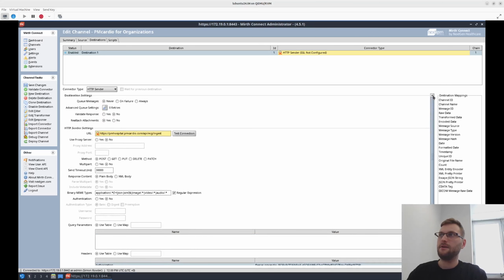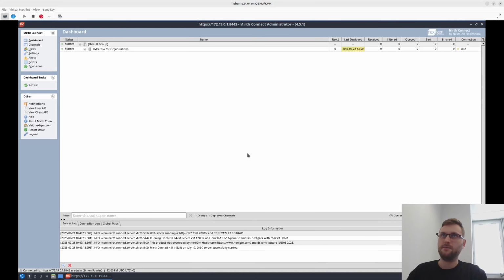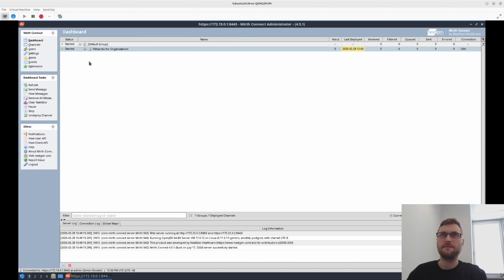I can now go ahead and deploy the channel using the deploy channel button here. This will save it and deploy it. You can now see the channel exists. It says status is started, and we can now test it out. I'm going to right click it and click send message.